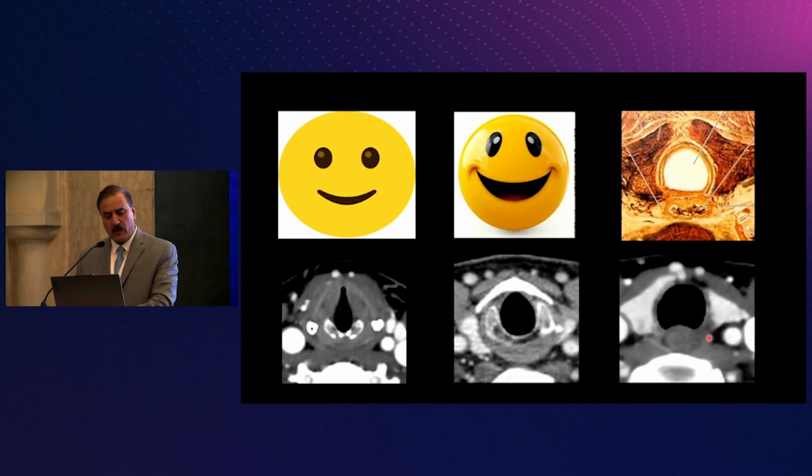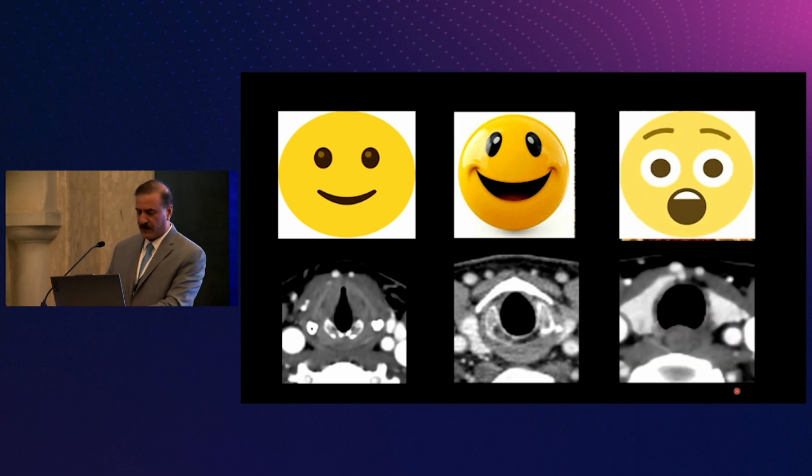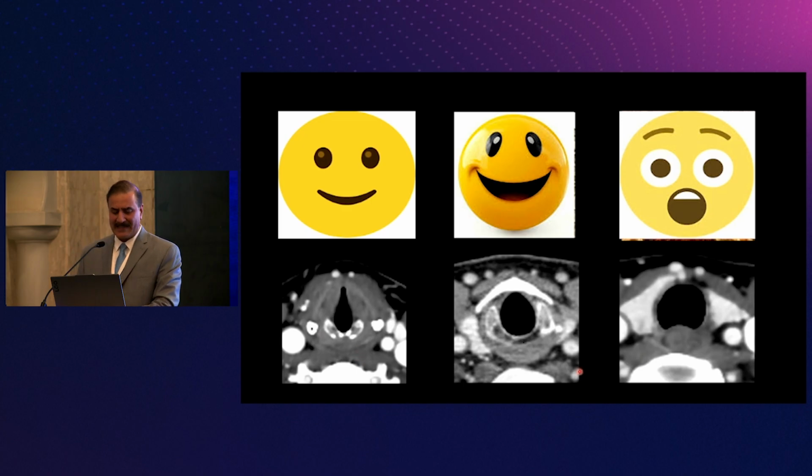But when you get into the cervical esophagus, you can see very nicely the rounded configuration there. If you're scrolling through, you can see some stripes there in the normal esophagus also, and that gives you like the surprised emoji. So remember these things, when the esophageal verge is also very important to recognize between the cervical esophagus and the hypopharynx itself.